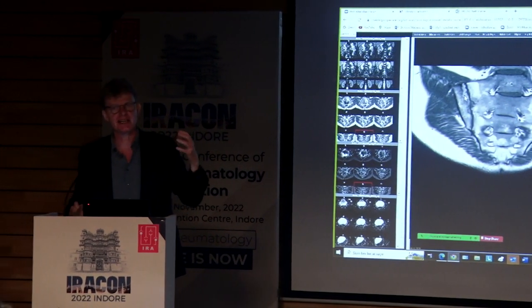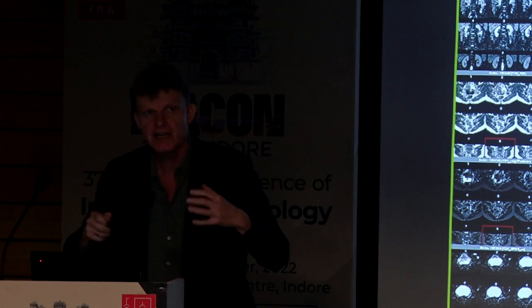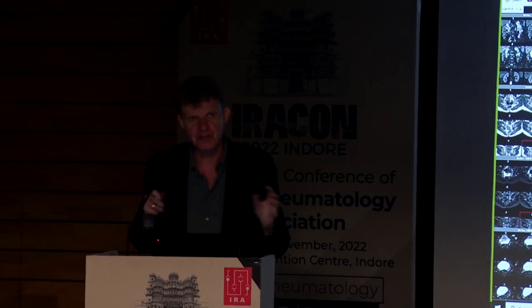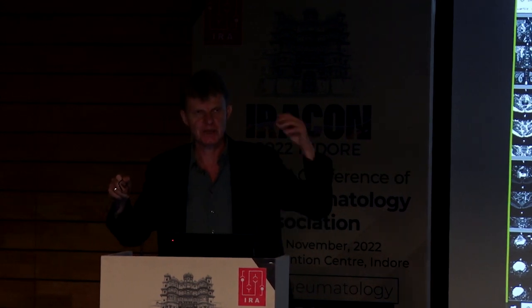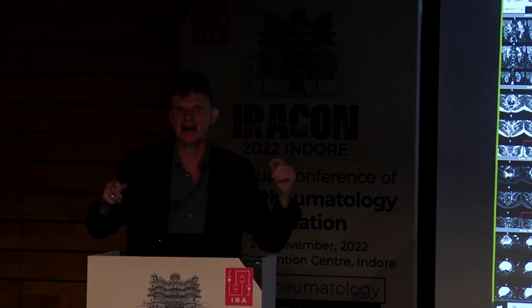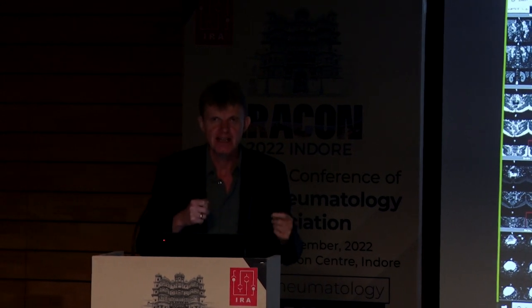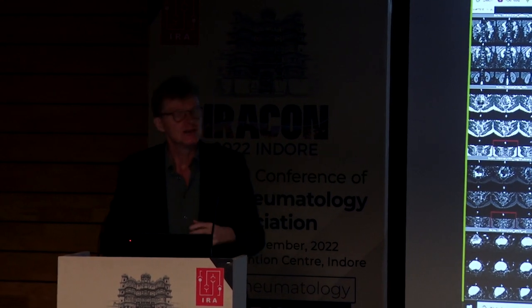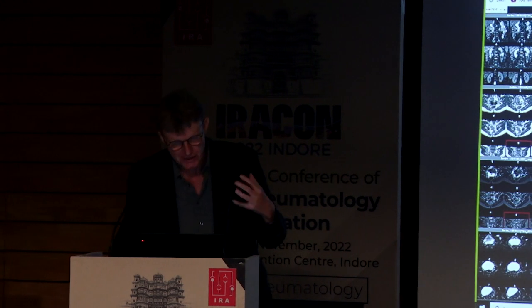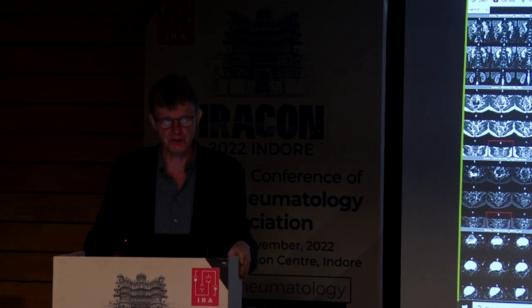The most important thing, when we use this in clinical practice, is that we're not scoring in a clinical trial where you're sometimes interested in seeing whether erosions heal or go away, and is it better in placebo or active treated. That's not what we're talking about in clinical practice. What we really want to know is, are we certain that this is an actual spondyloarthritis patient, and is there massive structural change? And the answer here is yes. And this is definitely not normal either on this side, even though we cannot call it backfill. So we are discussing some of those things which are important when you learn something, but in reality we just say severe structural changes with fat infiltration, backfill, and erosion.